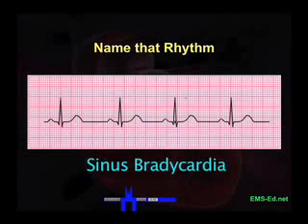So there you have it. Sinus bradycardia. Let's try another one. Let's play Name That Rhythm.